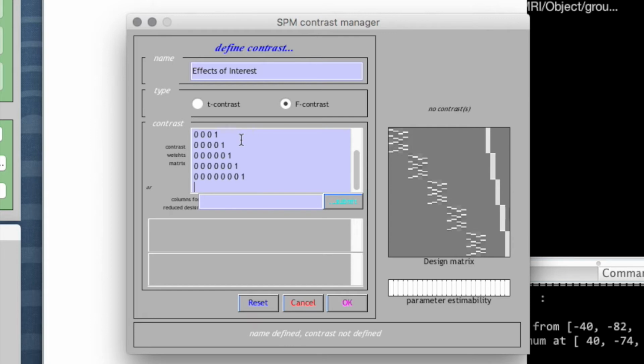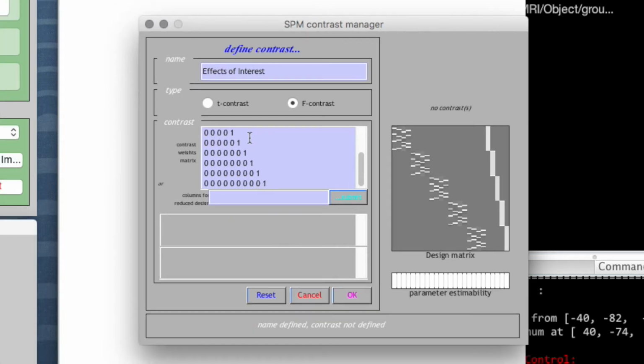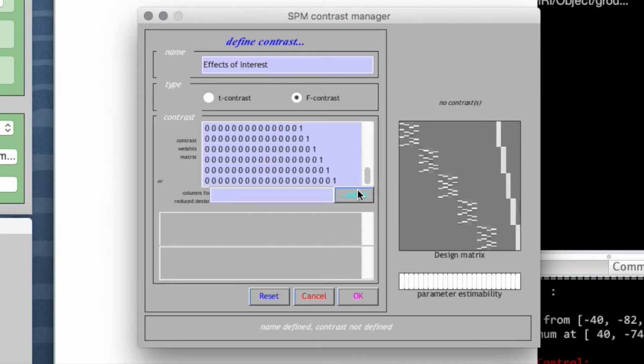And this is not super useful unless you've got some really bad data and you're not quite sure what's going on. And this will just show if, on average, any of the regressors is showing a difference from 0. Let's see if I've done that right.